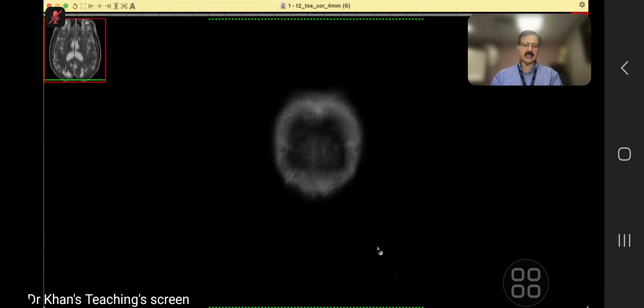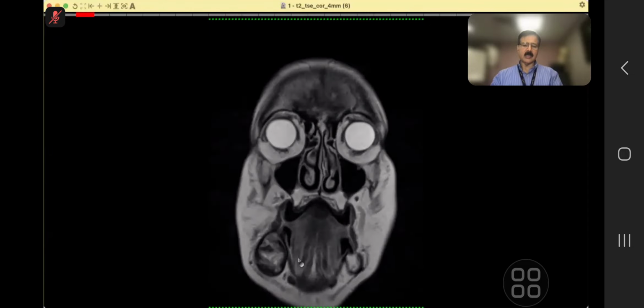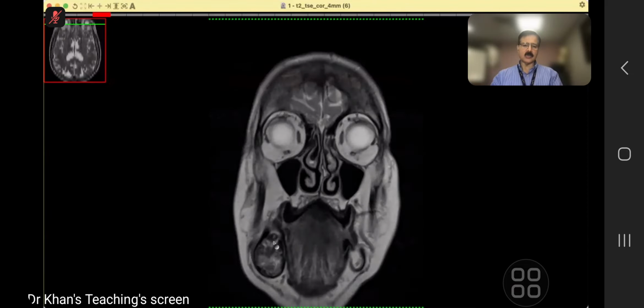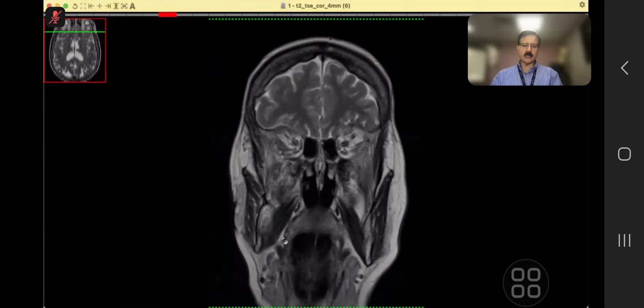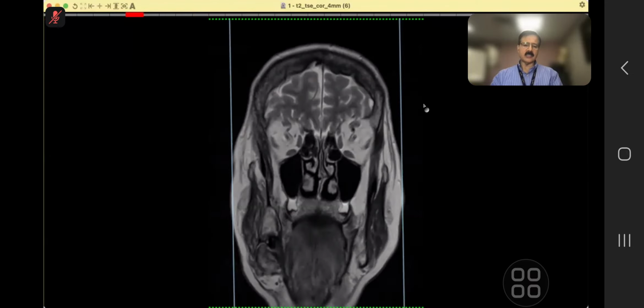A lot of head and neck is visible. So you can see this, and this is a classical exam case where there is tongue here. You can see the left hemimandible, right hemimandible, and you can see this expansile lesion on the right side. There is some low signal on this T2 weighted sequence. This might be blood products. And on this MR, there is a sagittal.